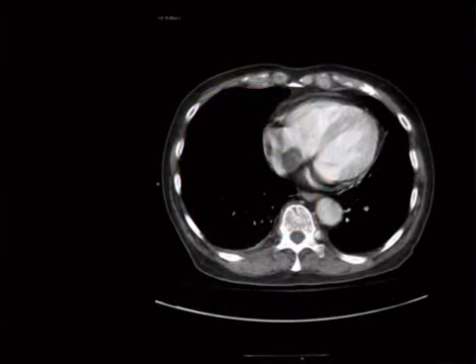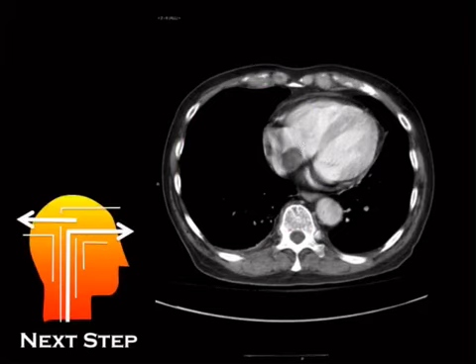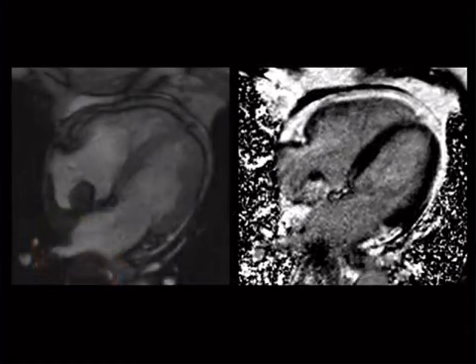All right, so another CT case. And we've got a mass here, a rounded mass. So what's the next step? I guess your differential is what? Your differential is going to be thrombus versus tumor. How do you tell the difference? You can get a cardiac MR, and you can use contrast to see if it enhances. The thrombus will not enhance, the tumor will.